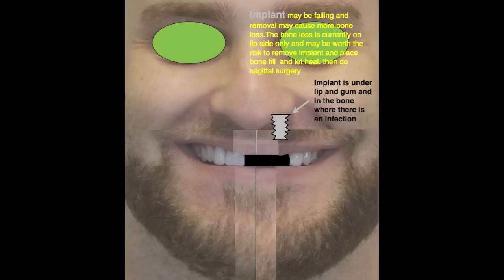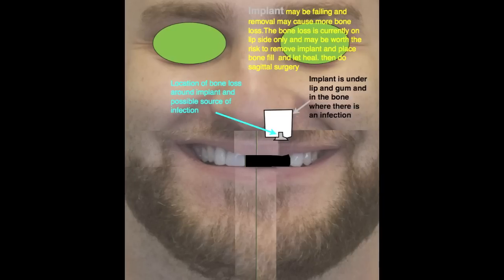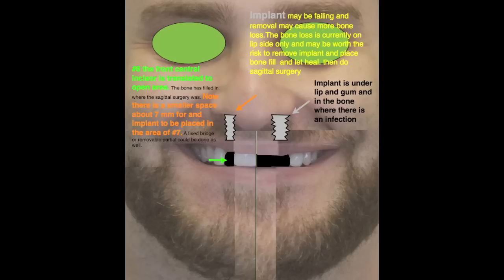And so you have a larger amount of space initially, and it would look like that. There would probably be a removable partial or something interim. It's possible to do something relatively fixed. Currently, the bone around the implant has that little fenestration area that might possibly be the source of the problem with the implant.